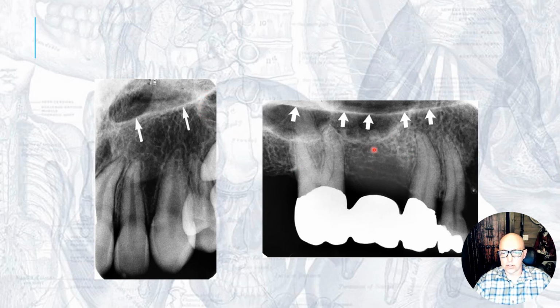And so again, orient yourself in this image, what you're looking at. You have premolars here. You have a missing molar and then a second molar. We're looking at the patient's right side because again, it's as if you're looking at the patient. And so if I see his molar back here, premolars up here, this is his right side. We see the maxillary sinus dip down in between. And occasionally you'll see far enough up into the image in one of these posterior periapicals that you'll still see the floor of the nasal cavity. It'll look more like a straight line, like this.